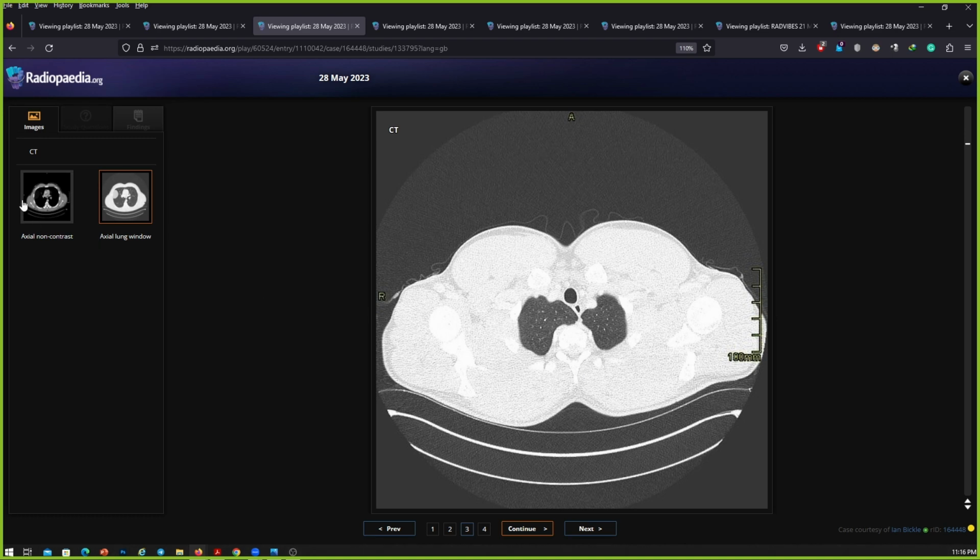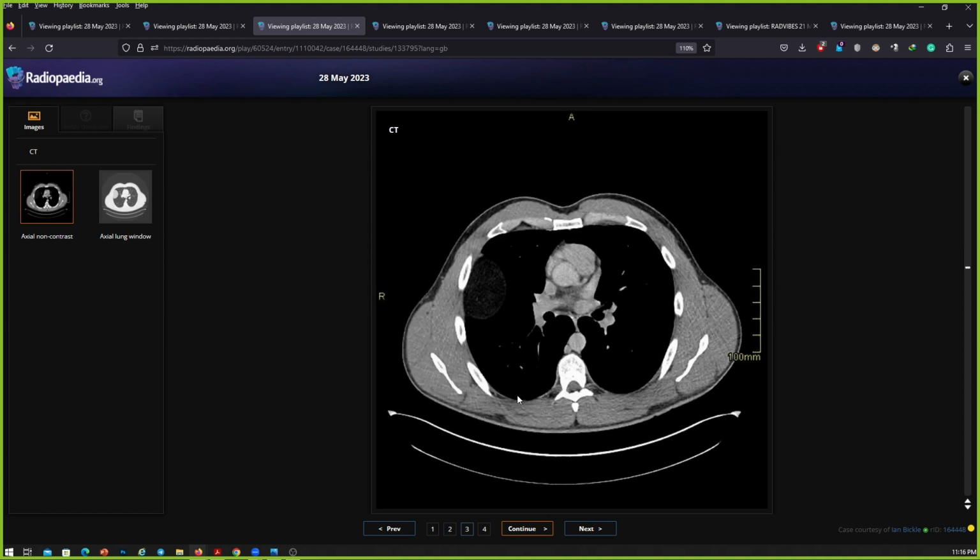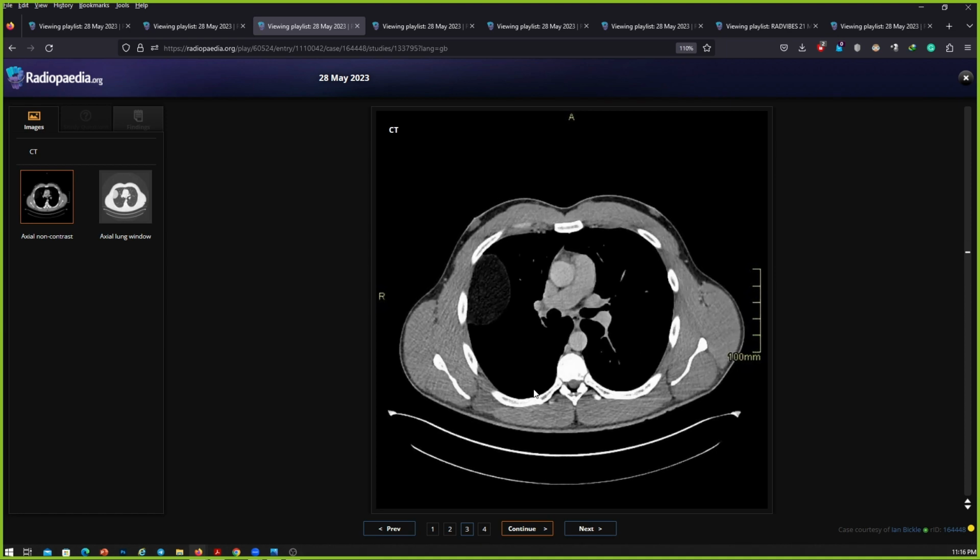So this was the case of pleural lipoma. On the CT scan, it is very evident. So with the image itself, would you be 100% sure that this is a fatty attenuating lesion? On the CT scan, it is mimicking the density of the fat, but we would check the Hounsfield unit. So always say that you will check that. It's always safe to say that before.